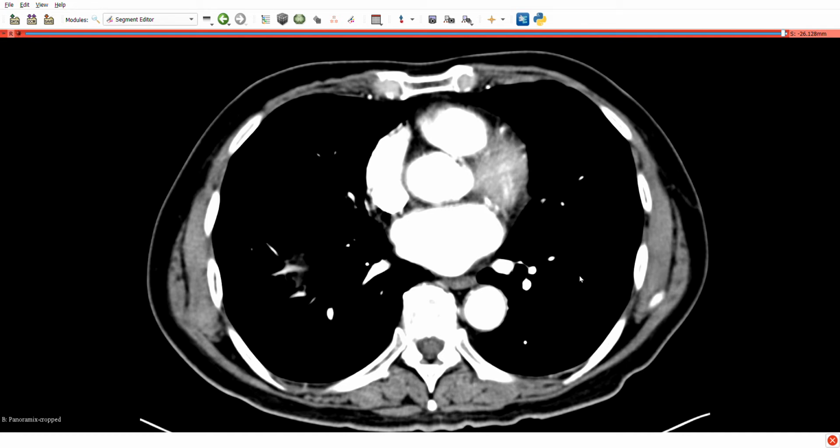So we're starting right at the bottom of the thorax, actually, in this view, and you can see these huge great black expanses of the air-filled lungs. Here in the center of the screen is the heart filled with contrast, and we can also see speckled within the lung fields the pulmonary arteries and their branches filled with contrast. Also note, here we can see the thoracic vertebrae articulating with their respective ribs. And prominent on the left-hand side, filled with contrast, is the thoracic aorta.